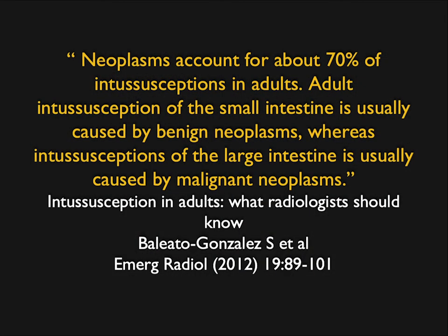This article a couple years back: neoplasms account for about 70% of intussusceptions in adults. So when we talk about obstruction, one of the things that you think about with obstruction, hernia, intussusception.